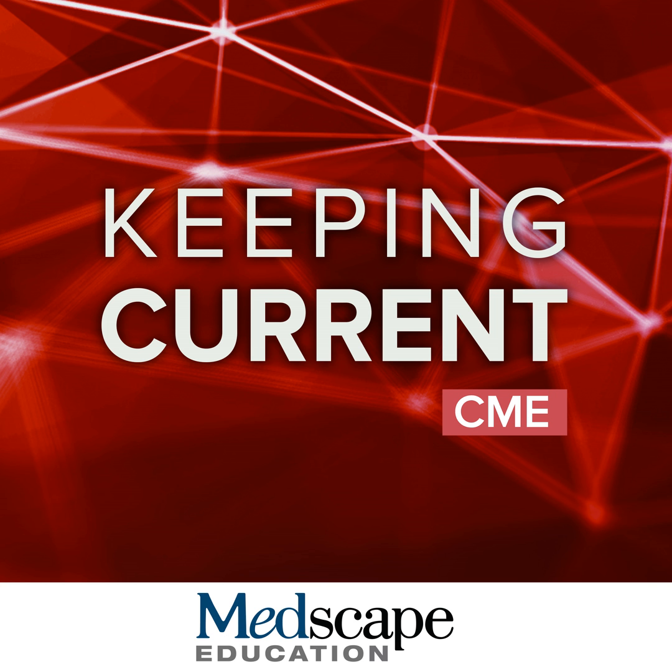As I mentioned earlier on, we also try to speed up the protocol by injecting the contrast early. And there have been a number of studies performed. This is one where they compared cine images with contrast administered and without contrast administered. And you can see that if you administer the contrast early, even though the myocardium looks a bit brighter, it has no impact really on the quantification of the ventricular parameters, such as ejection fraction, end diastolic volume, end systolic volume, and stroke volume. So really, injecting contrast is a very useful way of speeding up the overall protocol.